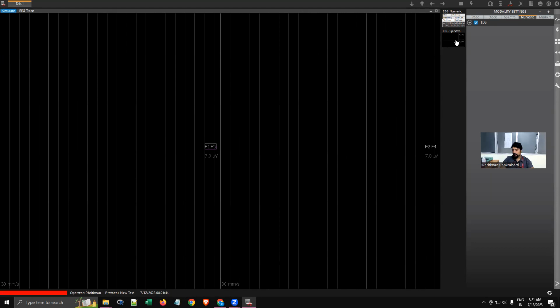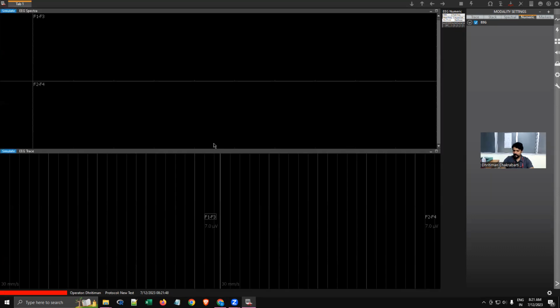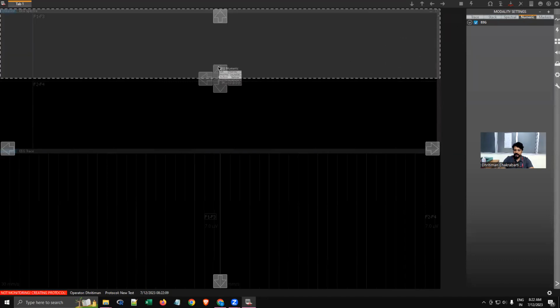Okay. Now we also want to add the spectra. So I just dragged it over. That's all I did. Now this middle portion where it tries to pre-select the area of the screen where you'll be putting it, that is a bit janky. That won't work very well. You just have to keep playing around. Like I'm dragging this. So here, see, it is going like this. I want to put it at the left side or the right side, but it is doing some weird thing.